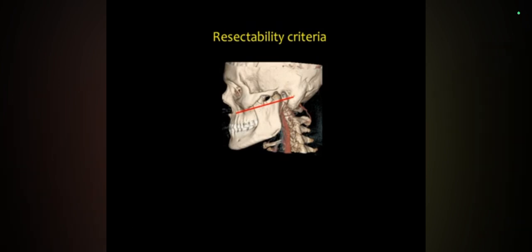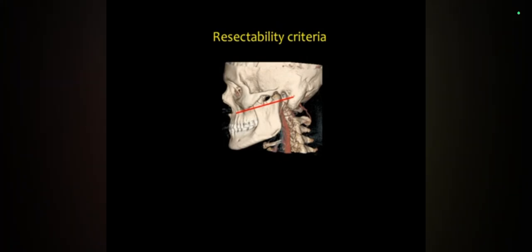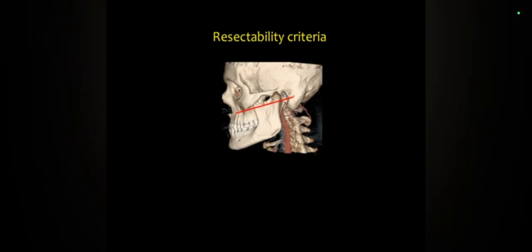Somebody the other day told me about obliquity sometimes. You said it, na? It was a very good point. Can you tell that? No, because sometimes, depending on the angle at which the axials were taken, you can see the mandibular notch at any level, but in sagittal you cannot manipulate it. It cannot come higher or lower. So if you want to see exactly whether it is reaching above the mandibular notch or not, you should see it on sagittal. So everybody understood.